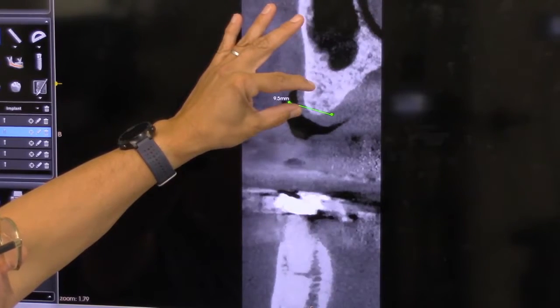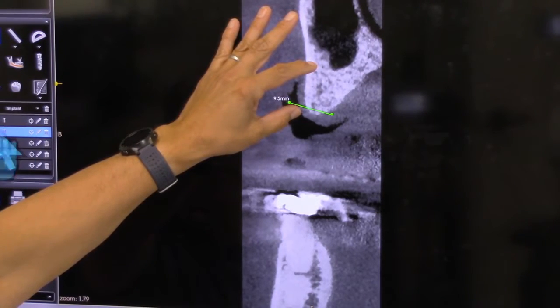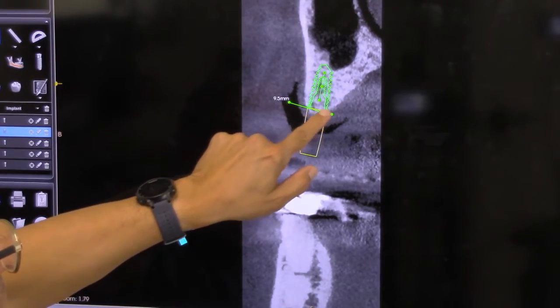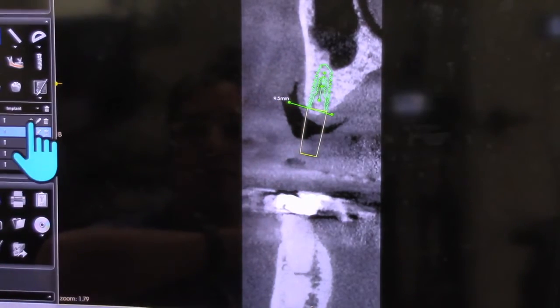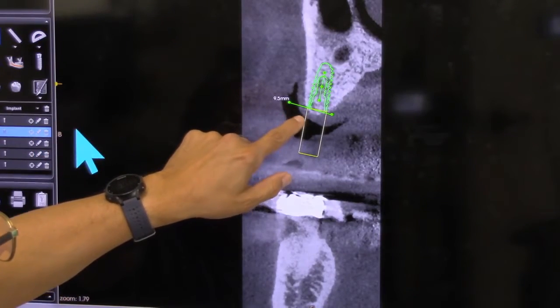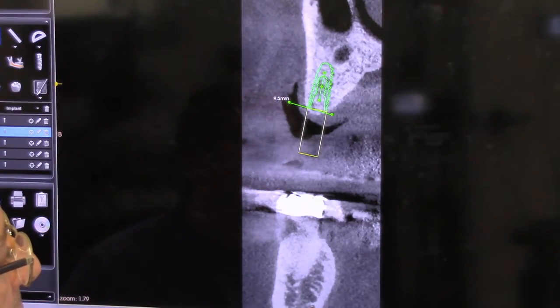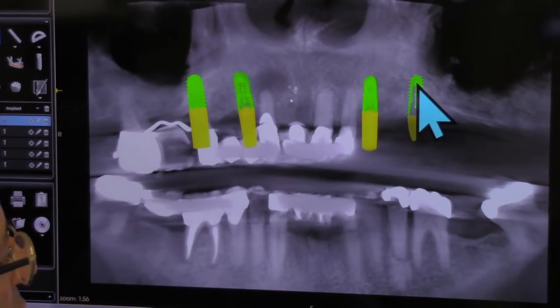We're going to go back up here. We're going to try to aim for about here. So let's see, we have an implant to put in, and that's what it's going to look like. So that's the nice implant placement. We're a little bit on the crest, it's a little bit thin, maybe we drop it a little bit more, but overall the actual implant here will be a nice sound bone, and maybe we drop it a little bit further in and get that going. So this is a nice case to do.